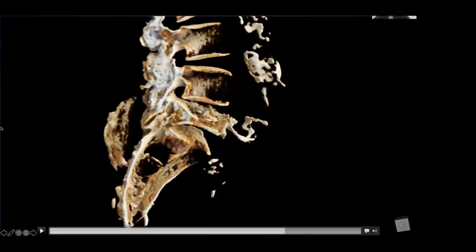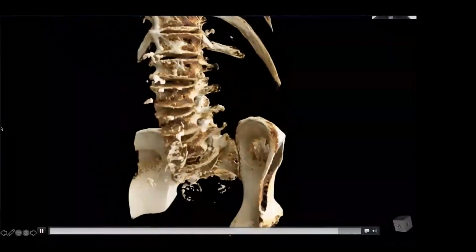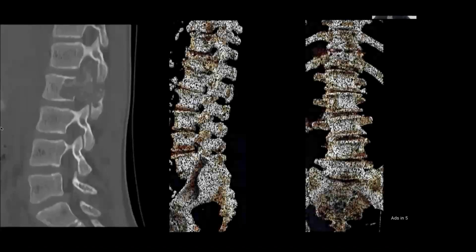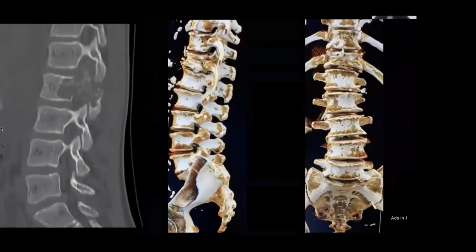He actually, after we treated this vertebra, he ended up fracturing this vertebra. We treated that, and finally got him on some anabolic bone agents. That's a top tip for you guys. If you see people, men and women, with osteoporotic fractures, please get them on the best possible osteoporotic medication as soon as possible. Again, just depicting your traditional CT versus these volume renders.